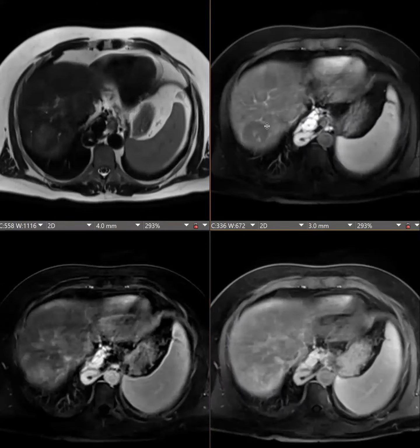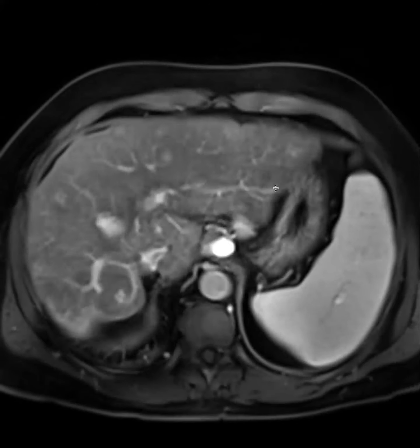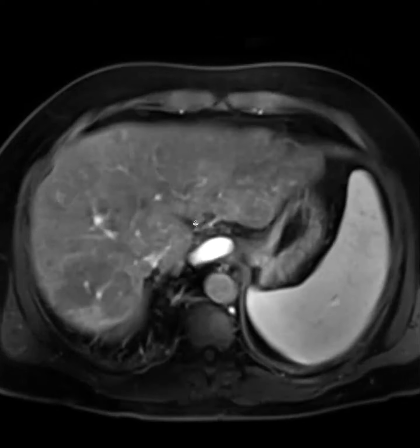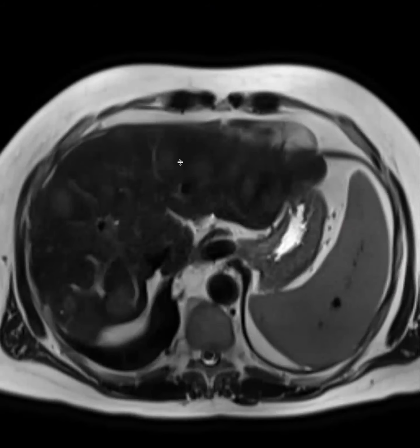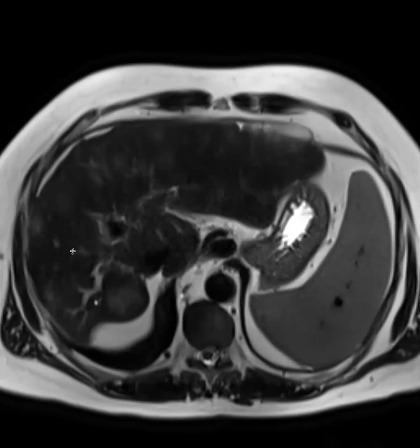So this is the arterial phase, and this is more of, I guess, what we were learning earlier from the Radiopaedia article about centrifugal. It starts in the center and then goes outside. It's sinusoidal dilatation or spaces, so maybe that explains the T2 intermediate signal here. I want it to be more bright like the other cases.